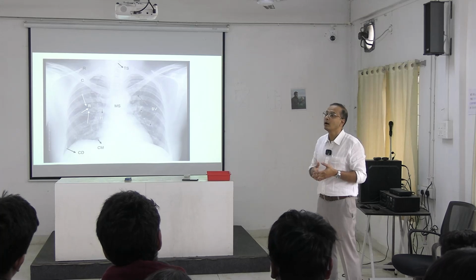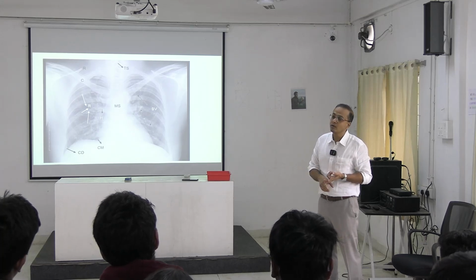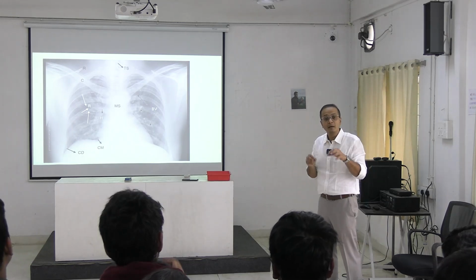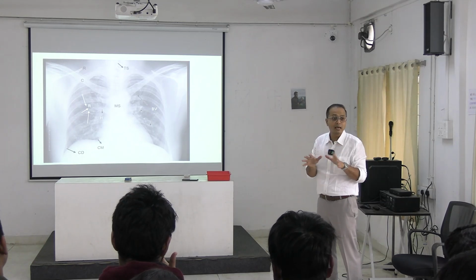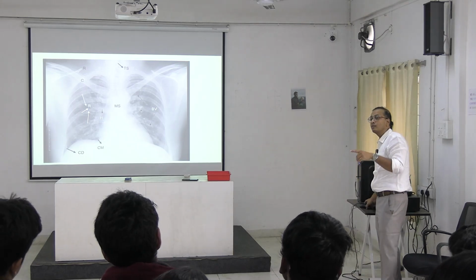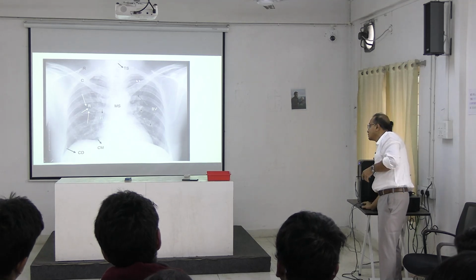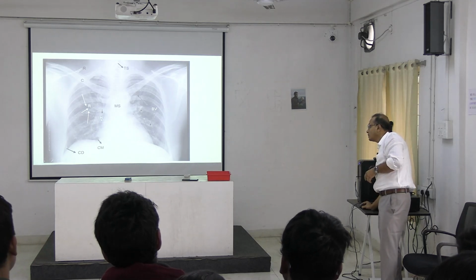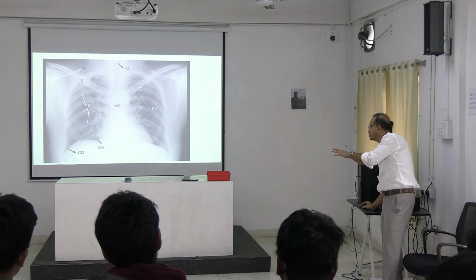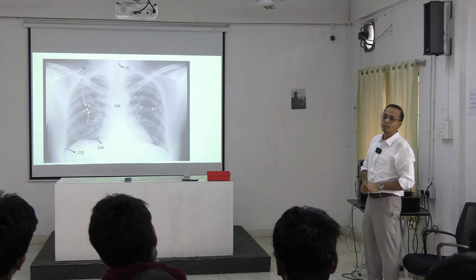In the lung also there are blood vessels, lymphatic channels, and bronchus and bronchioles that are splitting, and that impression makes the lung look hazy. So, we call them bronchovascular markings. These things we are seeing going in different directions look like the root of a tree, narrow things, and we call them bronchovascular markings.